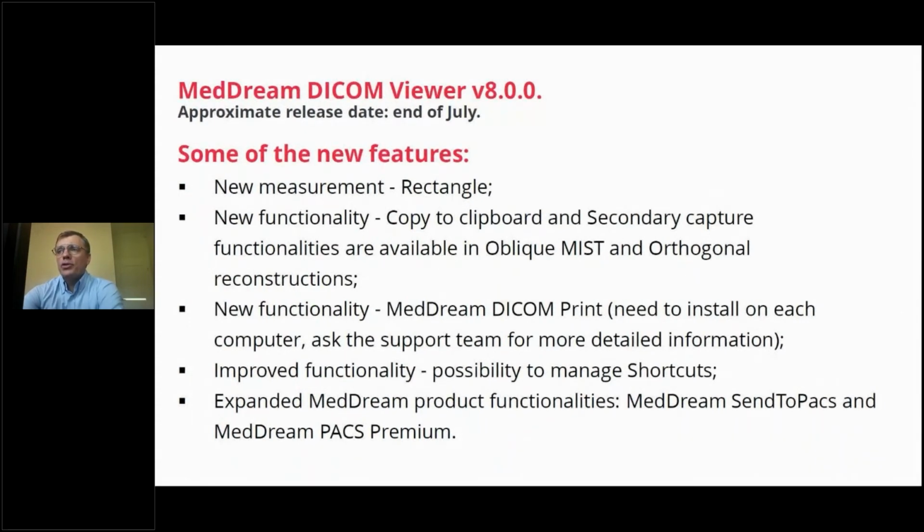As you saw, we already had secondary capture in most of the viewports except the missing MPR functionality. So our next release will contain the secondary capture possibility even from multi-frame images.